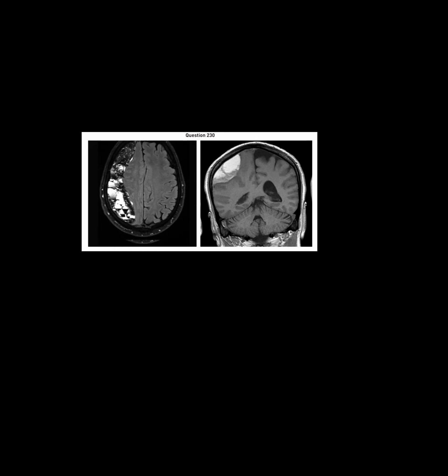It's very bright on T1. So what age do you think this is? There's a mnemonic about this age on the MRI. So let's say the T1 is bright. Do you have a T2? This is actually a FLAIR, which is kind of like a T2. Okay, so bright on the T1, bright on the T2, so that'll be BB, so that'll be somewhat subacute, chronic subacute. Right. So that'll be 7 to 14 days.